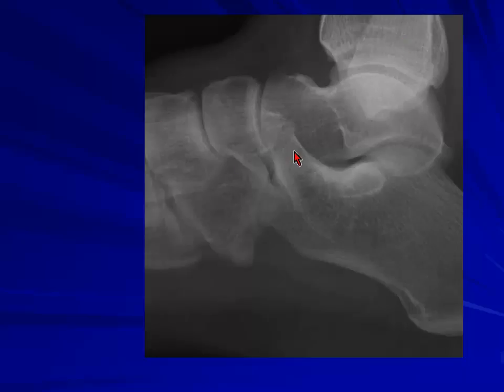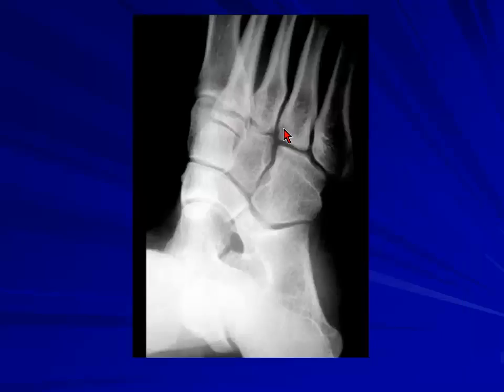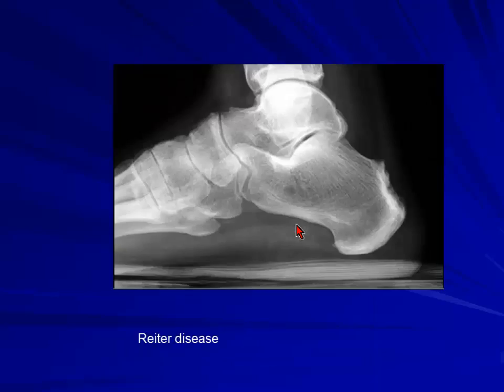But if you see this beak, this is not normal. The articular surface of the calcaneum should be like this. But this beak goes into the navicular on the medial side, and is articulating and forming a bony bridge. So this is calcaneonavicular coalition. You can see it here. You still see a line there, but it's not complete, but there is suggestion of coalition there.